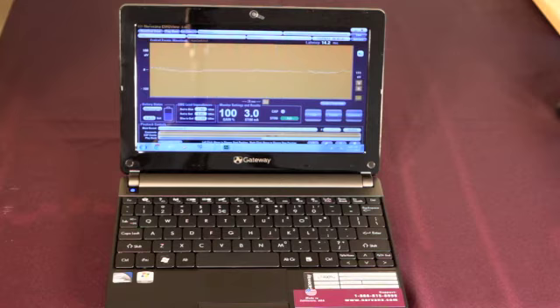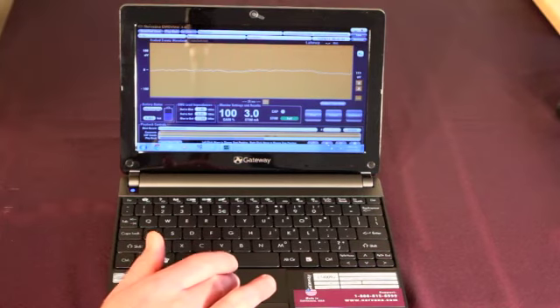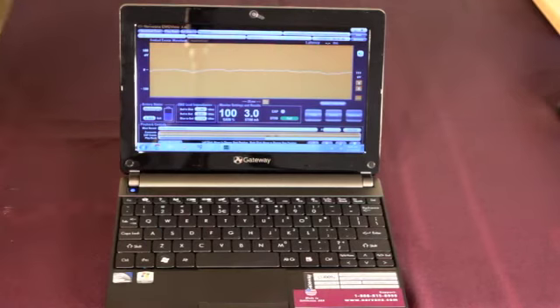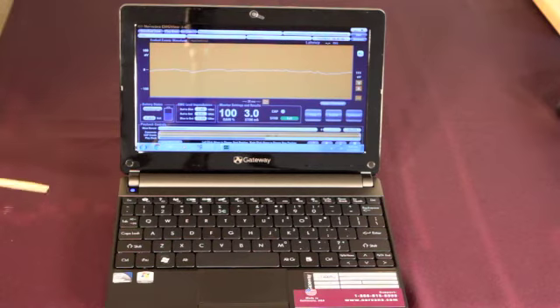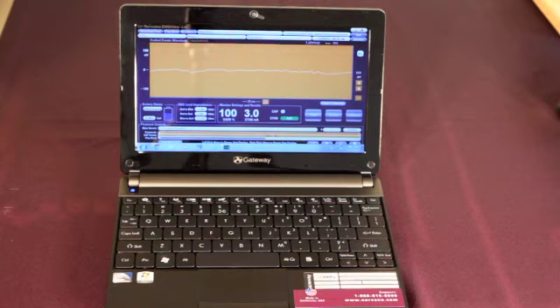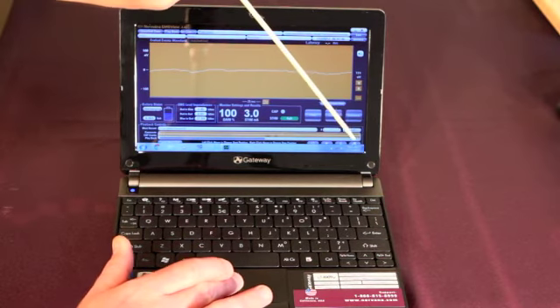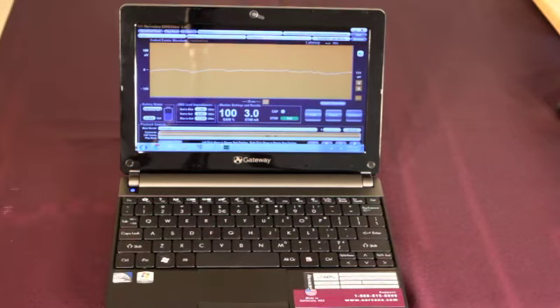And that brings me to the final point that I'd like to make, and that is you can jump to and view a particular point in the surgery through some controls that I'll share with you now. What I'm going to do first is I'm going to pause my playback file, and you can see my blue bar has quit advancing and my screen isn't changing. The blue bar is still there. If I were to push play, it would continue to play from that point. But I'm going to do something different. I am going to click on the stop button in the far right, and you notice the blue bar disappeared.